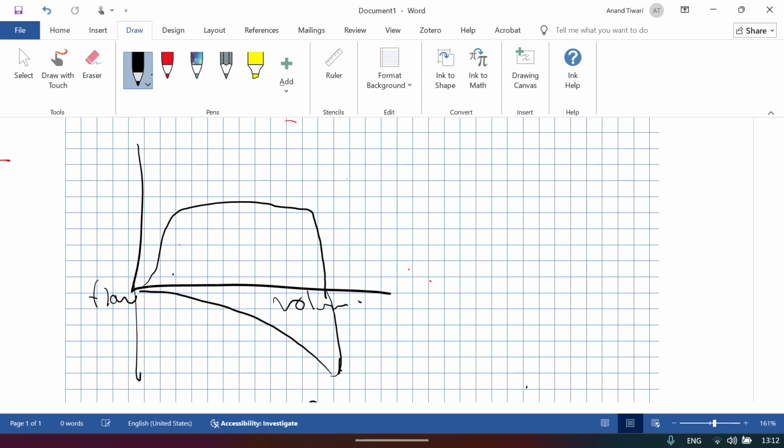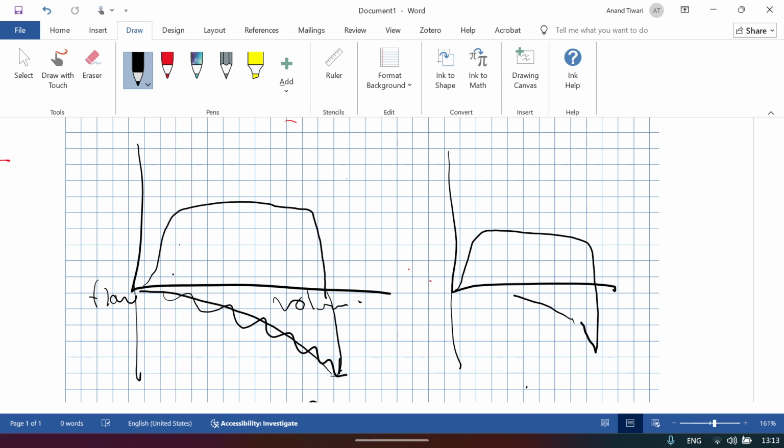Normally you will see this. In the flow-volume loop, again in the expiratory limb, if you see a lot of oscillation, like in the expiratory limb or flow-time curve we have seen, it will depict that the patient has secretions. Another abnormality quickly picked up on the flow-volume loop is reduced peak expiratory flow. This is inspiratory flow, and this is the scooped-out pattern you will see.